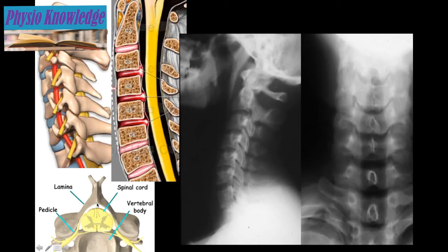Of course, you have the spinous process and the spinal canal here, but the hardest thing sometimes to identify, after you have identified the spinous process and the vertebral body, is the lamina and then the pedicle, which in this case is really seen underneath the nerve root here.